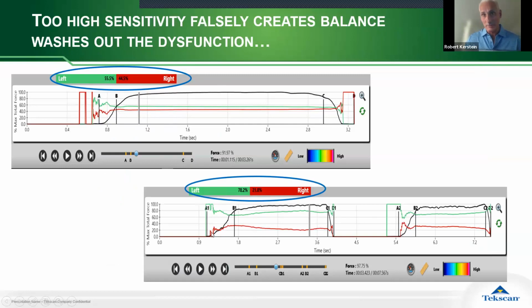This is bite 1. They're slow to close, they squeeze hard, they slow down, they get to near maximum force. They have to squeeze to get to maximum force, and the mandible's wavering. And you see the same in the second bite. They struggle to close. It's not a perfect straight line. Compare it to this one, how much easier it is, right? This is the one you want to work with.